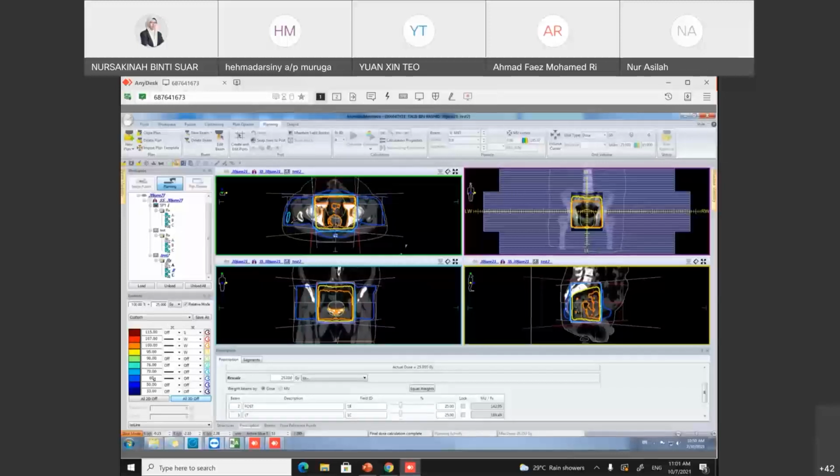You can see the light blue color here at the right extreme is a little bit of 70% dose compared to the left lateral. So it means the dose is not homogeneous. So we may reduce the right lateral beam dose, the percentage weighting, to another area.